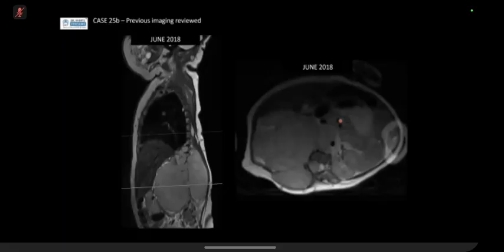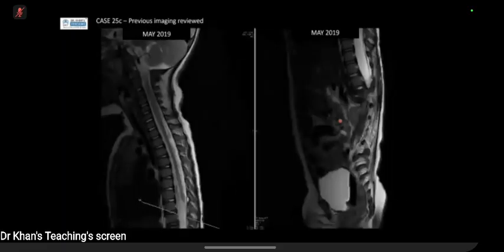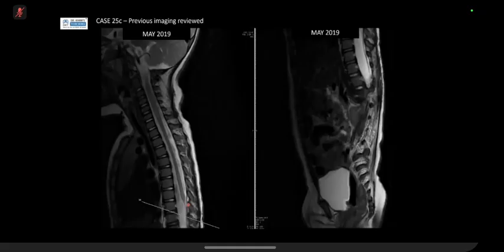So this just shows you that when you see neuroblastoma, the first thing you think of is bone mets causing pathological fracture. But I think the next image that I show you is that the patient's been treated. You see, this is your cord. The cord's atrophic essentially because of radiotherapy. I think the guy had radiotherapy.